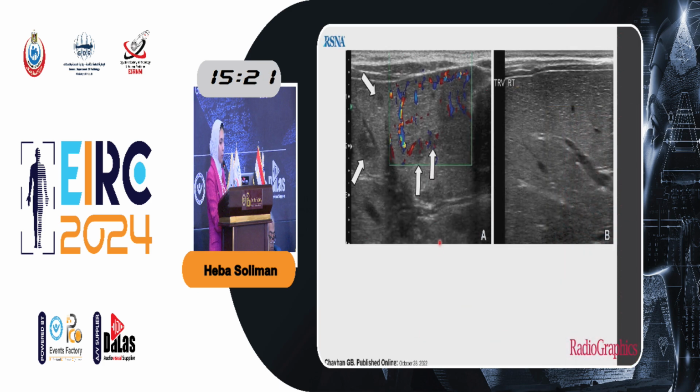This is an ultrasound performed for a 3-month-old girl showing multiple hypoechoic lesions that were suggested to be liver hemangiomas. And at the age of 11 months, the typical natural history of this hemangioma is the complete resolution. Note that infantile hemangiomas, in contrast to adult hemangiomas, appear on ultrasound hypoechoic, not hyperechoic.